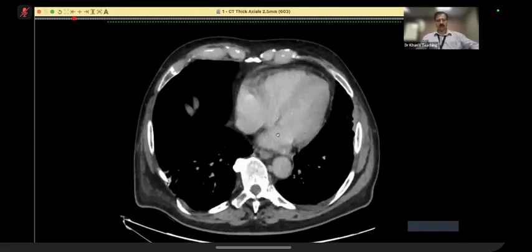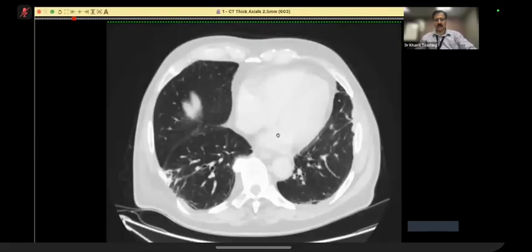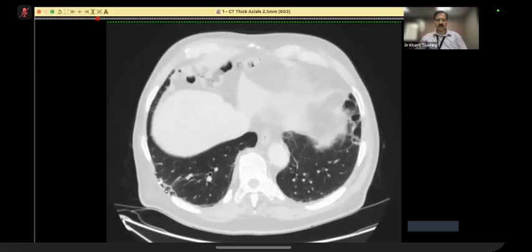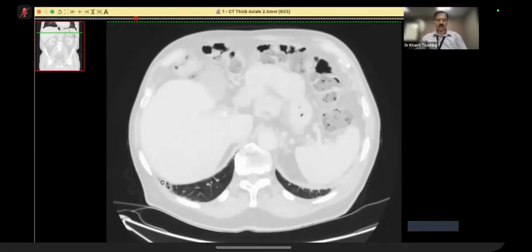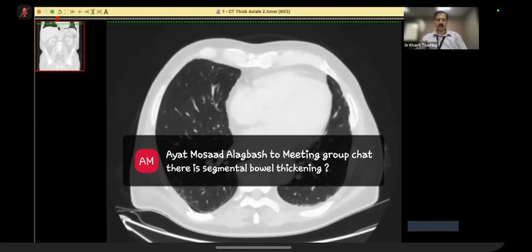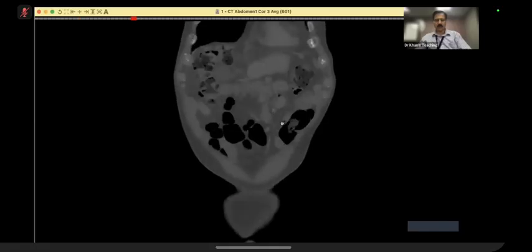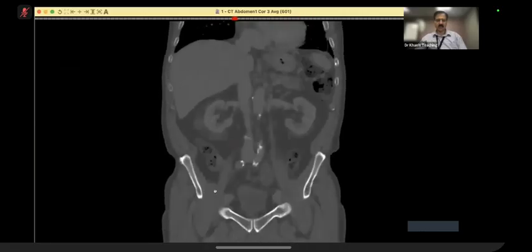Let's look at the possible manifestations in the visualized lungs, and you see these cysts here. This is one of the manifestations which you can see, and then some septal thickening, non-specific, but one can say that it is there. Now, if you go to the bone window and try to look for anything in the femora, we don't see any other stigmata of this.